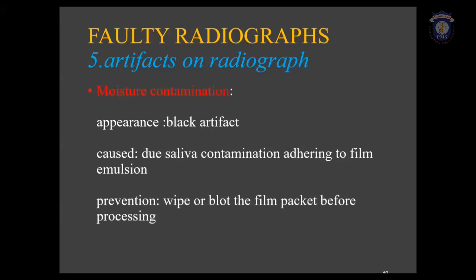Moisture contamination usually appears as a black artifact. This is caused due to saliva contamination that adheres onto the film emulsion. Wipe or blot the film packet before you start processing to avoid moisture contamination.